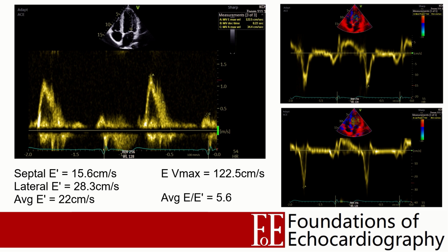When this ratio is small, it tells us that our muscle is moving quickly relative to the blood velocity and insinuates that our ventricle is good at sucking blood from the atrium. When the resulting ratio is high, it tells us that the muscle is not moving quickly enough to explain the observed blood velocity. The implication here is that the left atrial pressure is high and is pushing blood into the left ventricle.